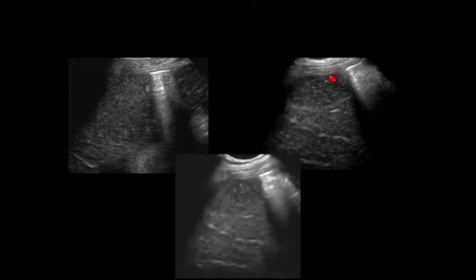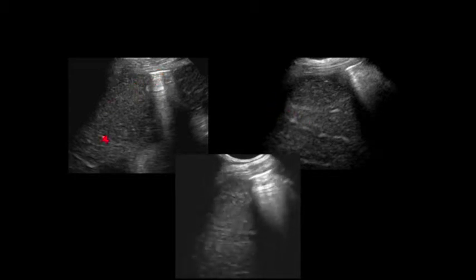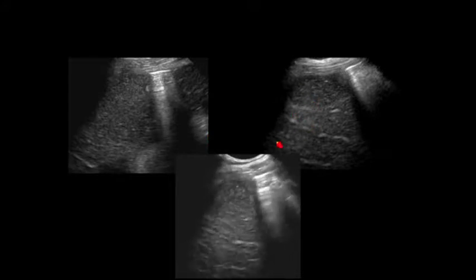Here's another case in which there's this odd air also, very linear. It's not in bowel. There's no bowel signature anywhere, and it's near the liver. And this is what the liver looked like. So is this a mass in the liver? Is this just a heterogeneous liver?